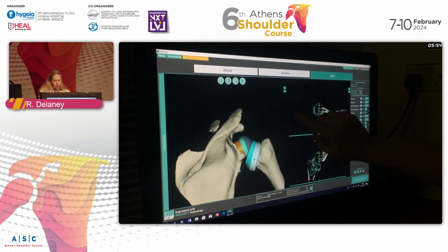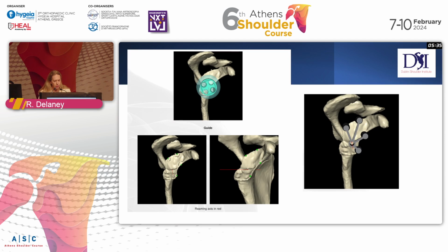So the way that I use the range of motion simulation is really to just compare different options. So it's a relative comparison rather than the absolute numbers. That's not necessarily the range of motion the patient's going to get, but if I change one thing about my plan and then look at the range of motion, that's how I use that. It's helpful as well to understand your custom bone graft through the planning software.